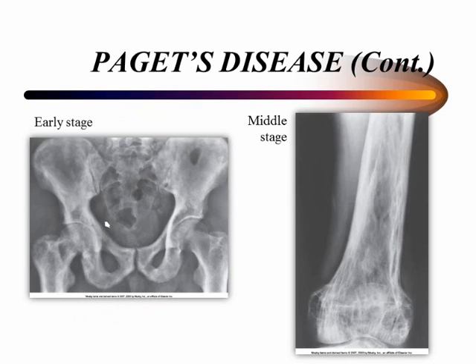In the long bones, the destructive phase almost invariably begins at one end of the bone and extends along the shaft for a variable distance before ending in a typical, sharply demarcated V-shaped configuration. In the reparative process, the bone is enlarged with an irregularly widened cortex and coarse, thickened trabeculae.